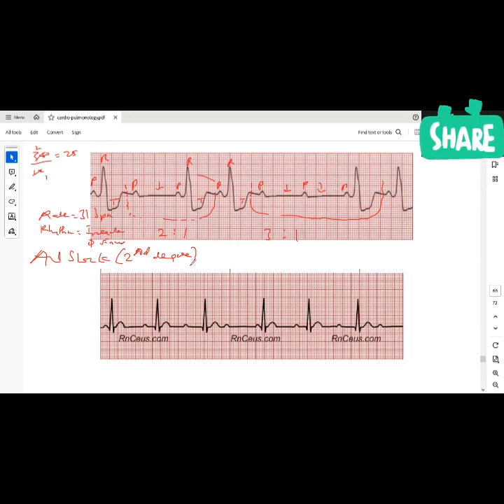So read the second ECG for me quickly. Okay. So we're going to do rate first.